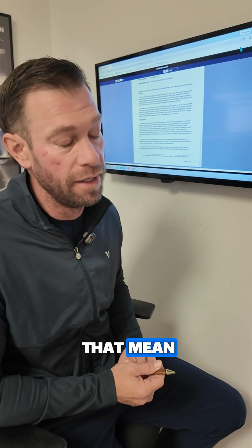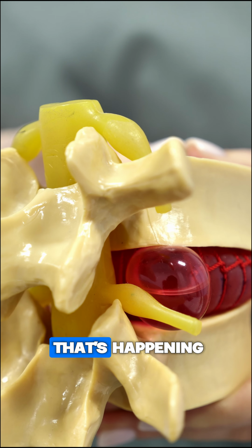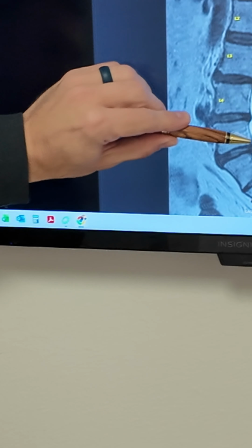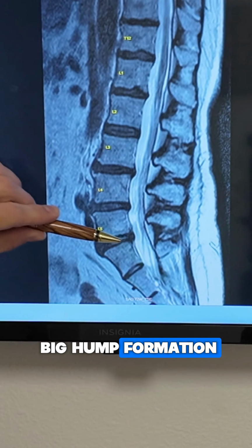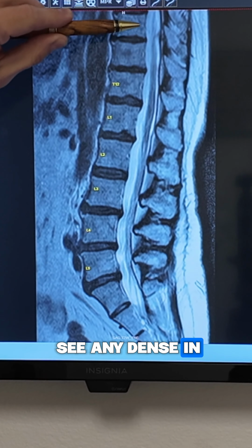My goodness, what does that mean? Well, in simple terms, the extrusion means the type of severity of the disc herniation that's happening. You have a protrusion, then you have an extrusion. An extrusion means that we're actually pushing more back into the spinal cord structure right here, and now you can see this big hump formation. What it's supposed to look like is nice and smooth right here. You don't want to see any dents in the spinal cord.